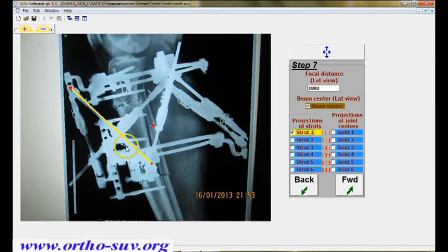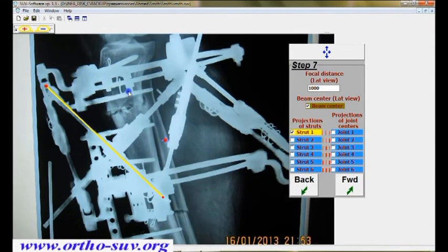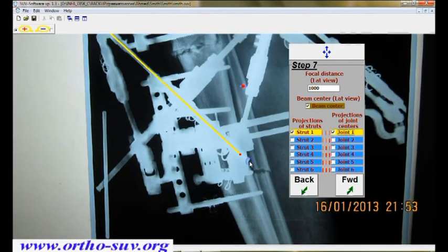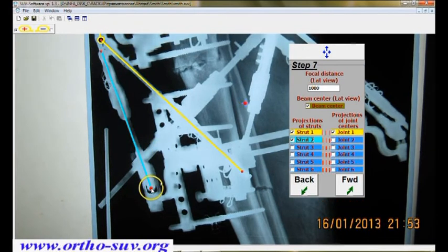We had drawn this line, and now we align it with the middle of the strut's projection, and now we will point the joint of strut number 1, and align the shoulder of strut number 1 with the bolt center, and find the joint center.